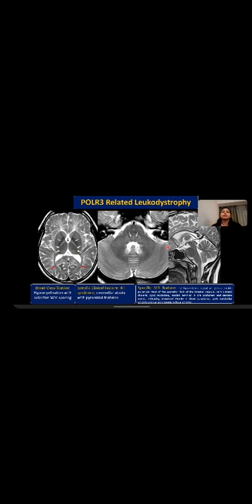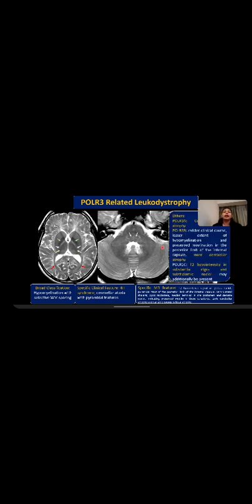And usually it is accompanied by corpus callosal and also cerebellar atrophy. And apart from this broad classification, even the subunits can have different features. There's no need to remember so much, but just for telling you that POLR3A, if it is involved, then corpus callosal atrophy is predominant, POLR3B, cerebellar atrophy is predominant, and POLR1C, T2 hypointensity of the substantia nigra and subthalamic nuclei are more prominent.